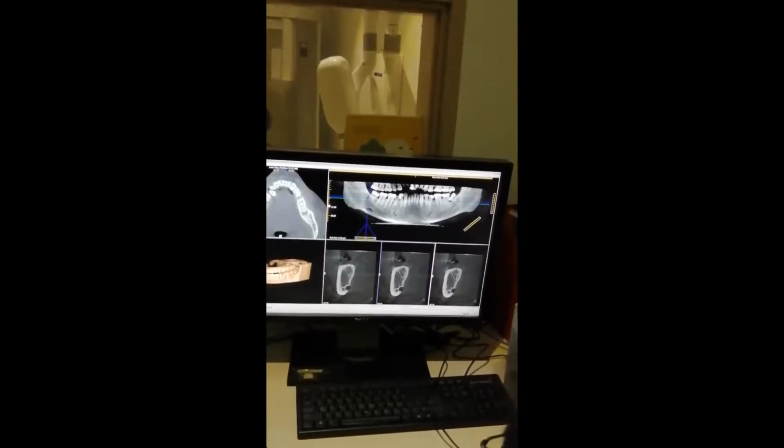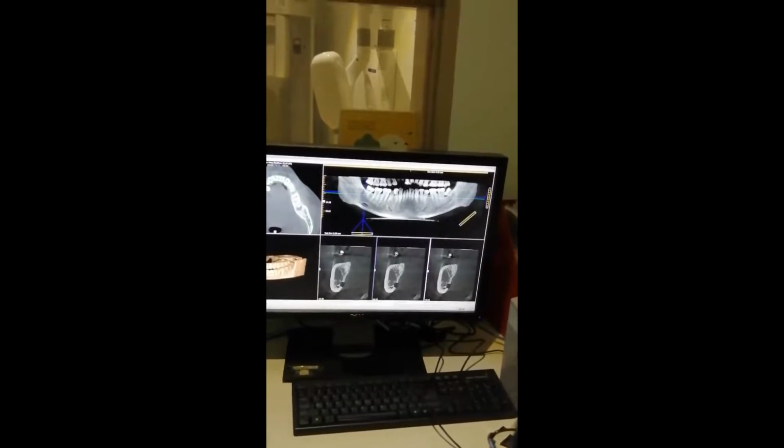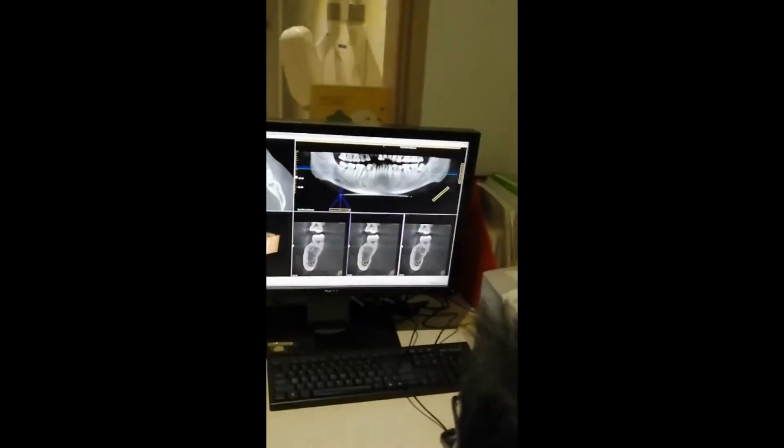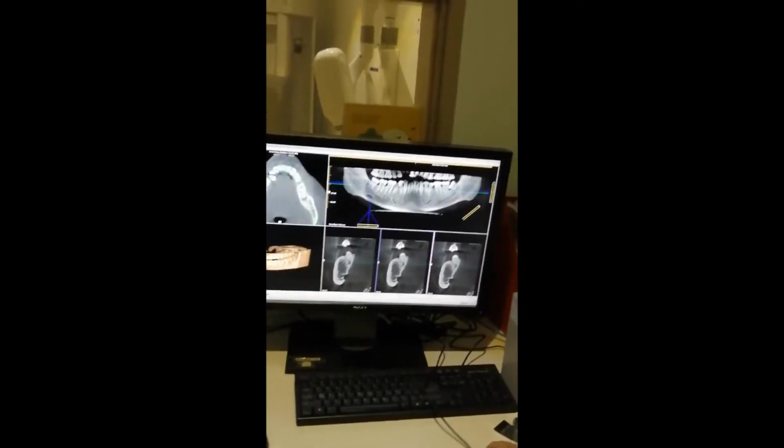There's one bone depression. There's no bone over there. What is it called? There's one depression, not something else. No, it's this one, this black color. Yeah. What's that? It's actually airspace.